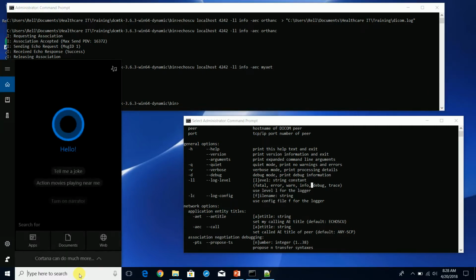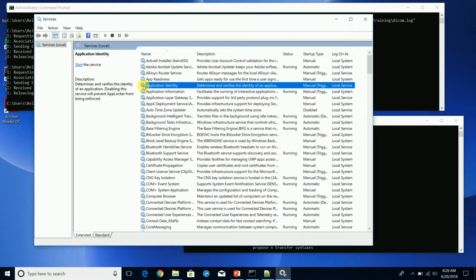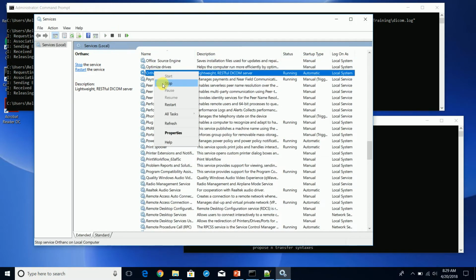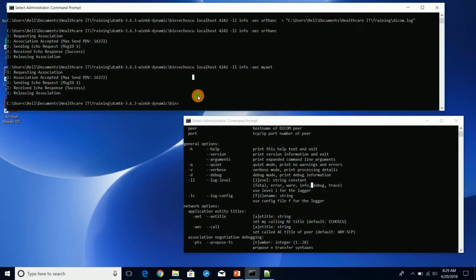We've got to open up services. Open up services. We can stop it. Restart it.